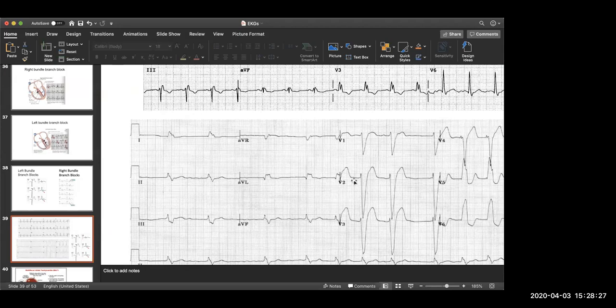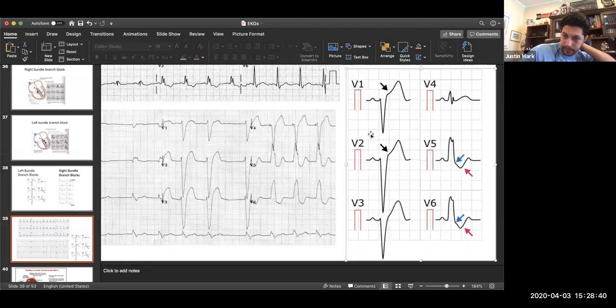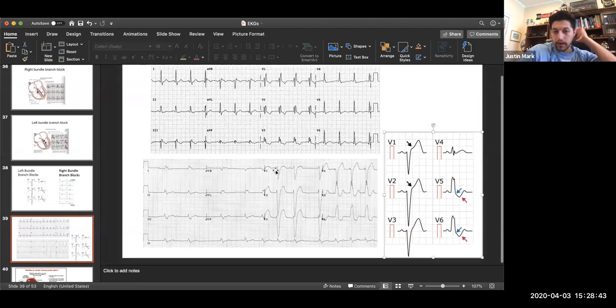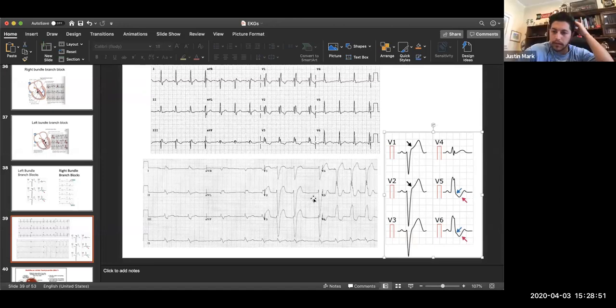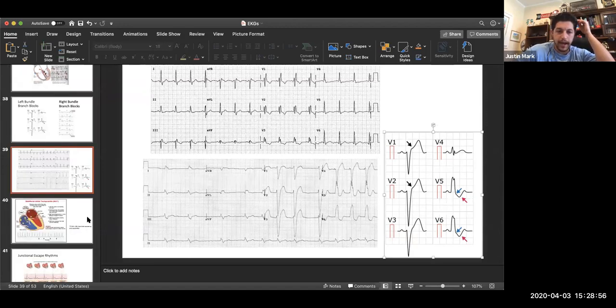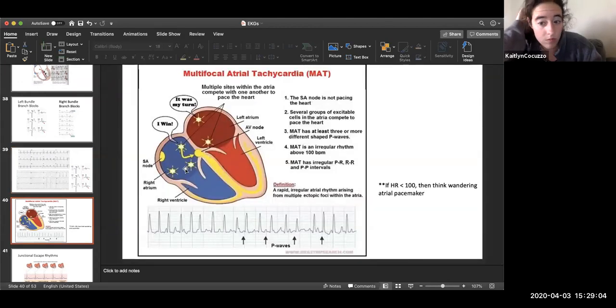Yeah. But Todd, you were correct. The first thing to look at is the QRS complex in terms of width. I should have mentioned that. The wider the QRS complex, it implies that there's a delay in the conduction system. And then you explained it very well with everything else. Again, I don't know if we need to know why the shapes are happening other than recognizing it. So that's that. We have another finding here.